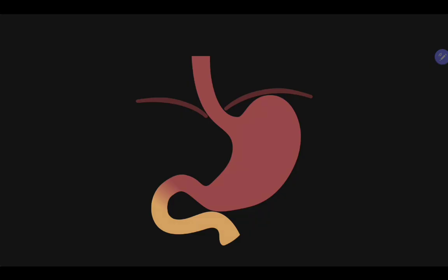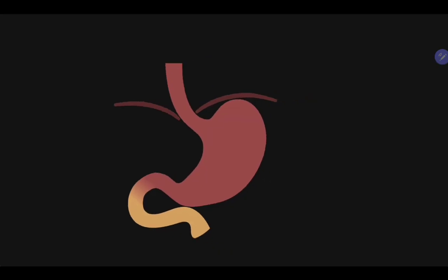So that wraps up the esophagus and CT alternatives to fluoroscopic exams, and it is now time for us to continue our journey below the diaphragm and cover the important gastric pathologies that you should be aware of.